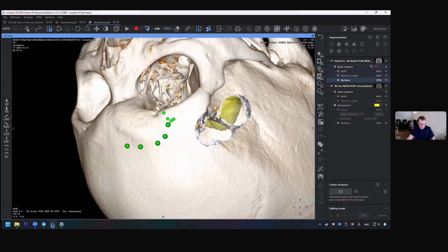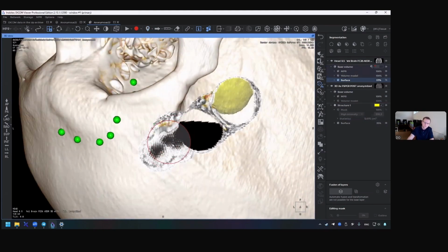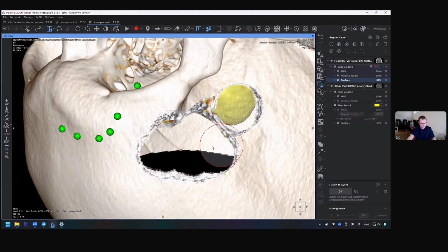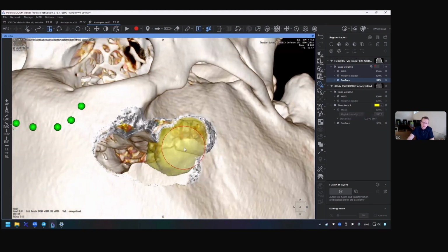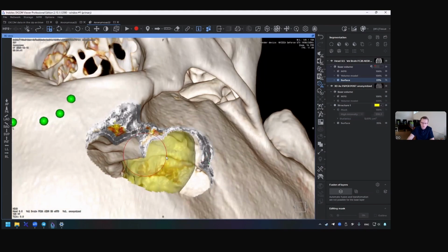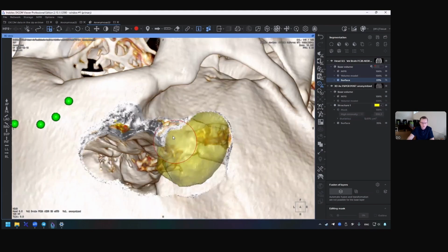Let's continue our craniotomy without opening the frontal sinus. Having CT angiography, we could reconstruct all major vessels just at the tumor, but this is not the case.